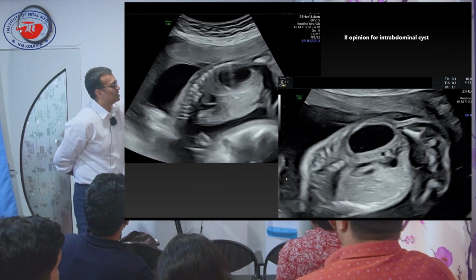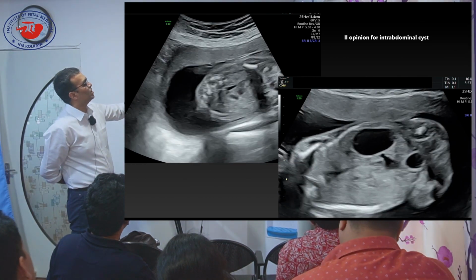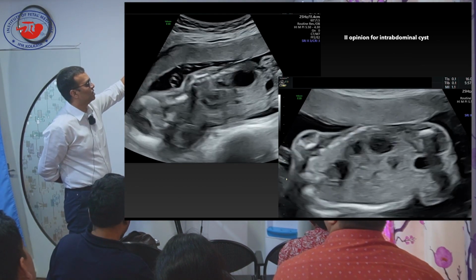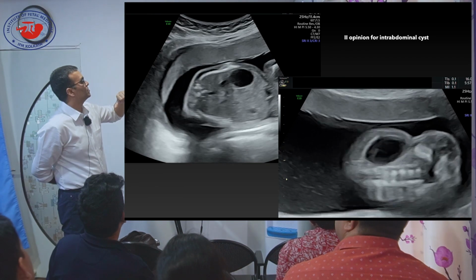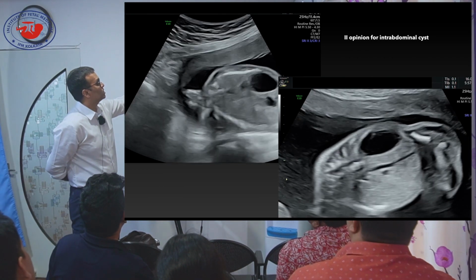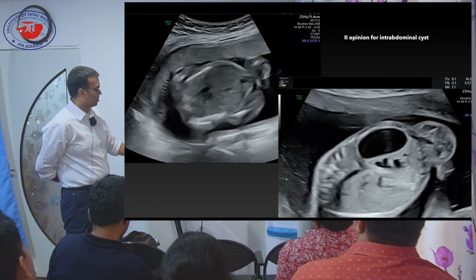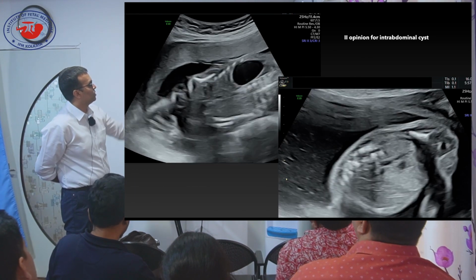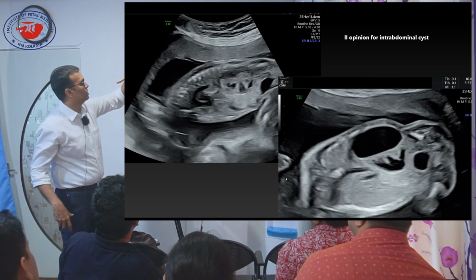You see this? Renal pelvis? Then how come the cyst is above the kidney on the capsule? Urinoma. Yes, fantastic. So this was a case of perinephric urinoma, because if you see here, this renal pelvis is there, and the cyst is on top.